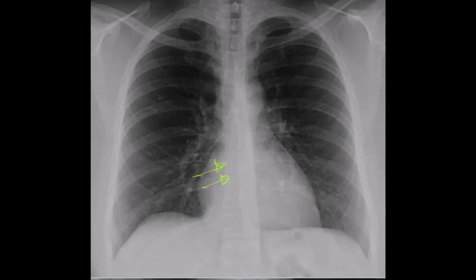That might mimic some of the findings in emphysema and can be mistaken for a pneumothorax, where you have a jet black appearance. Here you might think, oh, I can see only jet black appearance, this patient doesn't have bronchovascular markings, then this patient might have pneumothorax. So be cautious not to overdiagnose pneumothorax in a patient who is overpenetrated, because to diagnose pneumothorax, you should be able to see the pleural white line, and we will talk about that later.